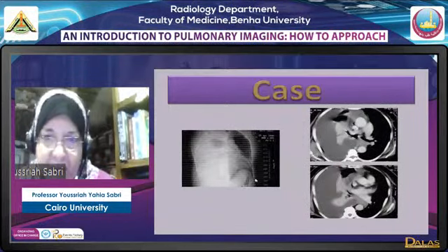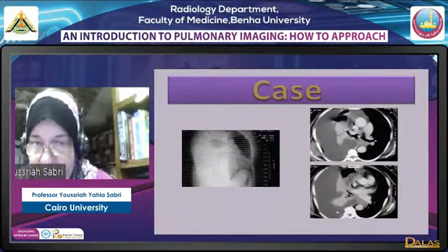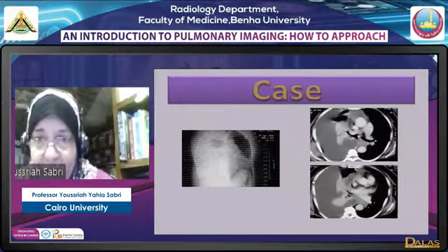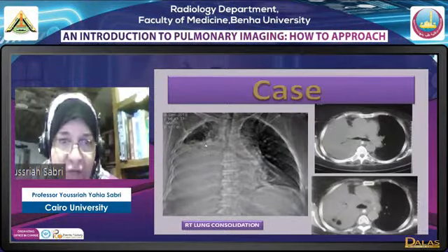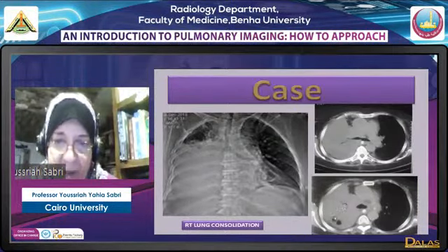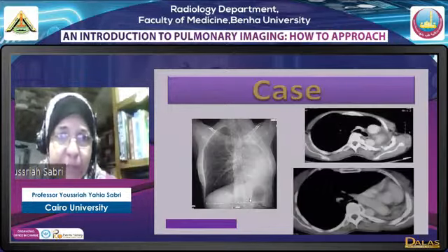Now, CT findings here, we have the massive effusion, we have the relaxation collapse of the lung, and we have contralateral shift. Now, here we have near total opacification of the right hemithorax, central mediastinum, air bronchogram, and cavitation. This is right lung consolidation. The air bronchogram is present, and there is no effusion.